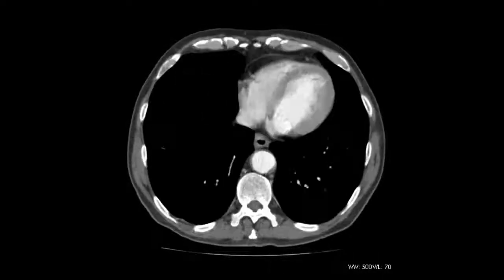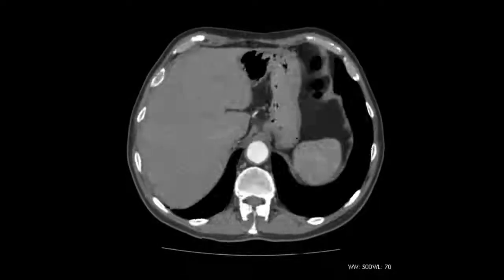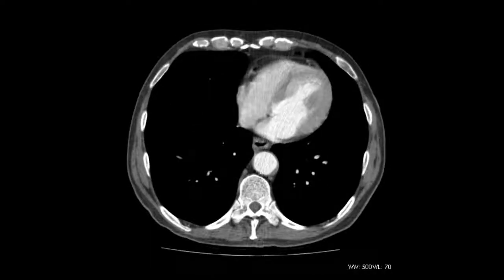A lot of people are going to be watching this who haven't really had much experience with CT. So the black stuff, it depends how you set the windows, but the black stuff tends to be air. Yeah, that's right. Without getting too bogged down in the physics, exactly the window you use will depend a bit upon what you're interested in. For example, at the bottom of the screen you've got some numbers which give you the window width and the window level.